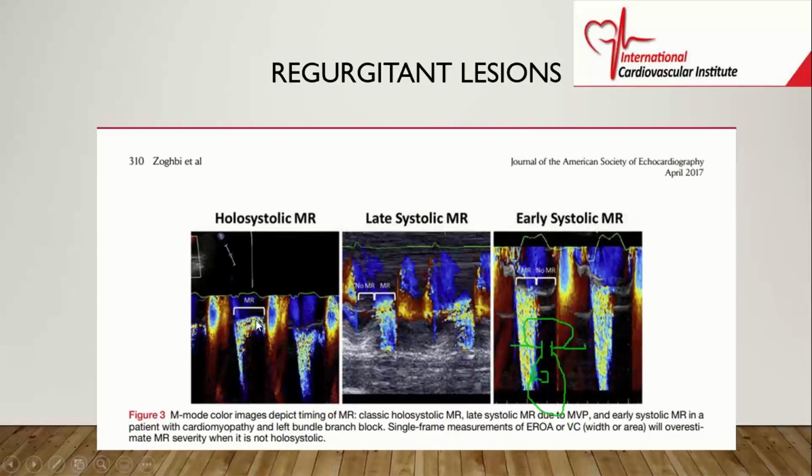So it's holosystolic, as opposed to this one, the same setup, but systole is from the onset of the QRS to the end of the T wave, but you have nothing here in early systole, nothing. The mitral regurgitation is all late systolic, and you can get this with mitral valve prolapse. And then let's look at this one as well.